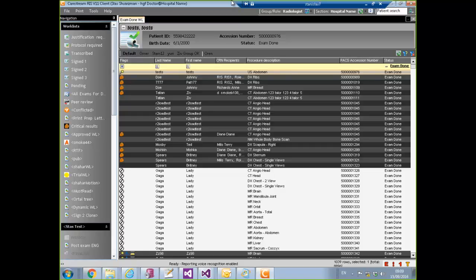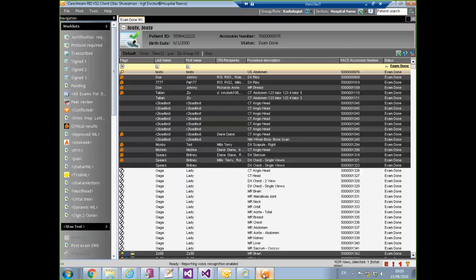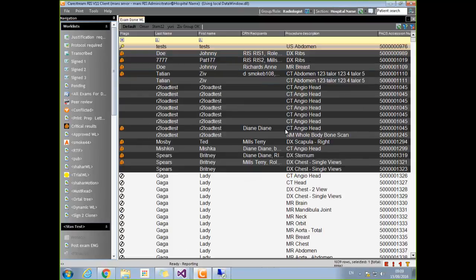Small introduction. Now we will present a new instant messaging feature that is currently in development. We will release it in the final 11.2 version. Now it's still in progress. We just want to introduce it to you, just to get a first impression. Okay, Mani will present it.